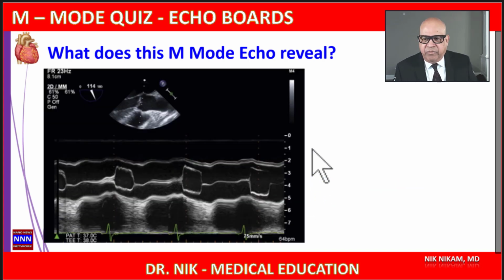All right, take a moment here, see what you're observing, write down everything that you see that relates to this image, then we will proceed. There are a lot of important points in this particular image. That's why I am posting this one.